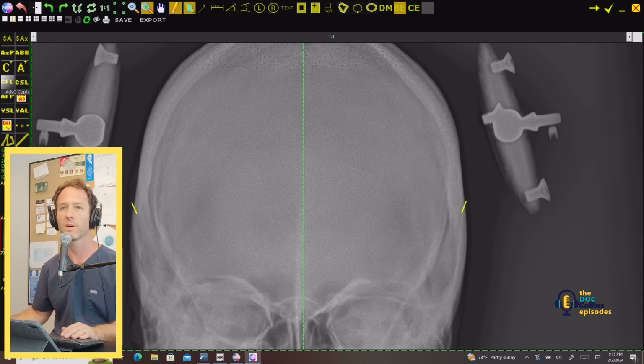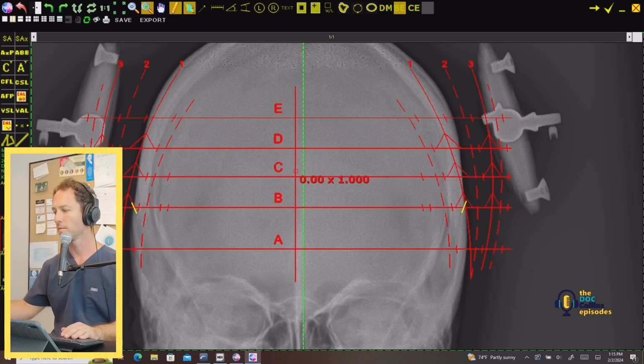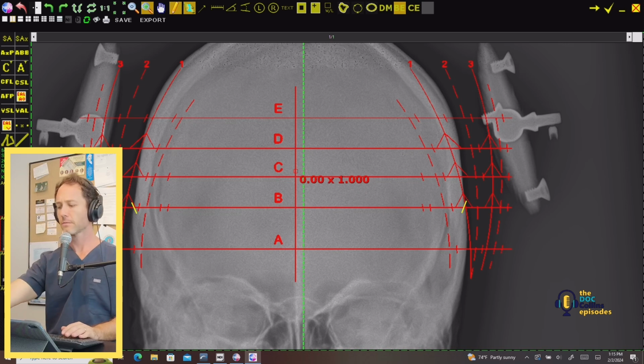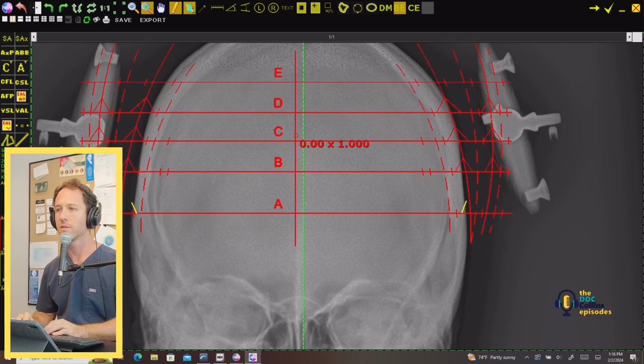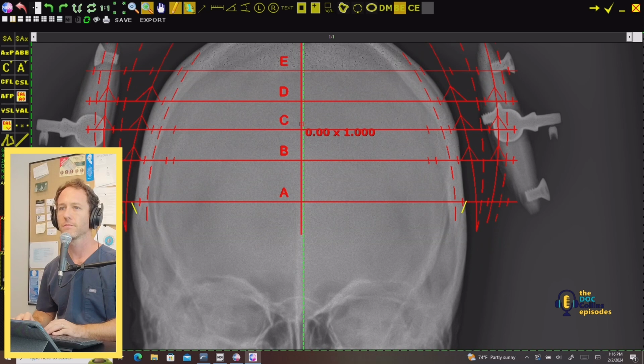And within advanced orthogonal, you use a process called zoning. And that's the template that we use for zoning. It's a little bit crazy looking, but it's not bad. Now, because we marked our temporoparietal sutures, little yellow marks there, we can scoot on up. And again, the most reliable osseous structure for producing your FCL for analysis is going to be the 1 to 2 inches above that suture line.